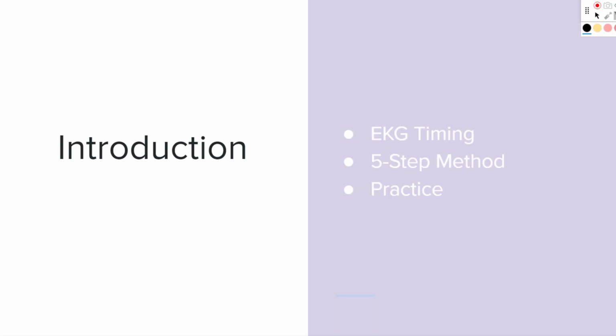All right, we're going to review EKG timing. We're going to go through the 5-step method to solving an EKG, and then we're going to practice.